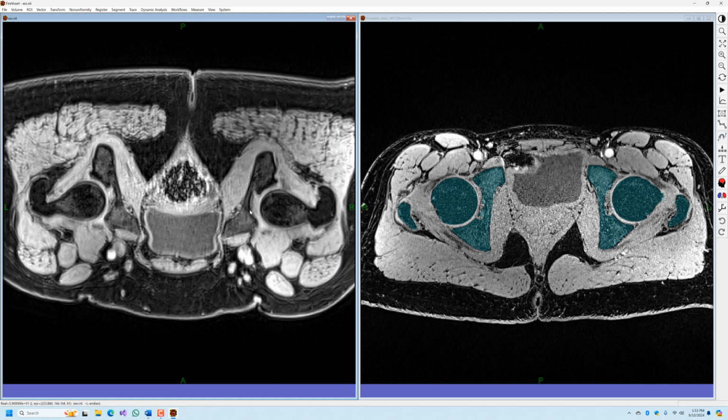Some of the target cases were provided in the matching projection, and some were provided in this mismatching projection.